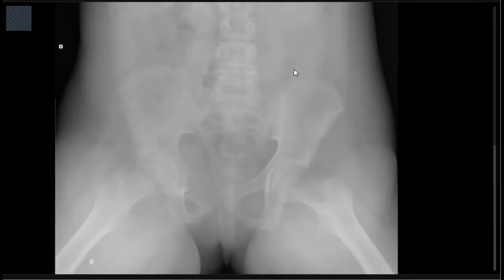For the pelvic radiograph in this patient, I want to see the bones first, as per the history of trauma. I'm looking at the cortices, and here, for example, I have noted that there are bone fragments in the area projected inferior to the acetabulum and the superior pubic ramus.